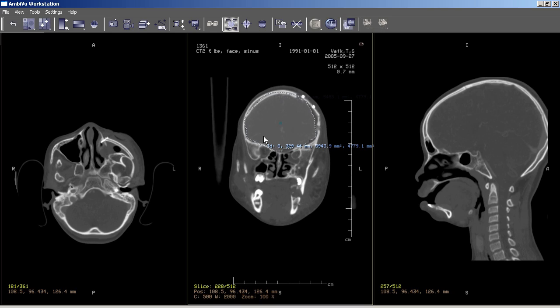It's possible to have many different, I call them regions of interest, per slice, and you can have many different annotation IDs, and they can also work on different projections, axials or coronals or sagittals.